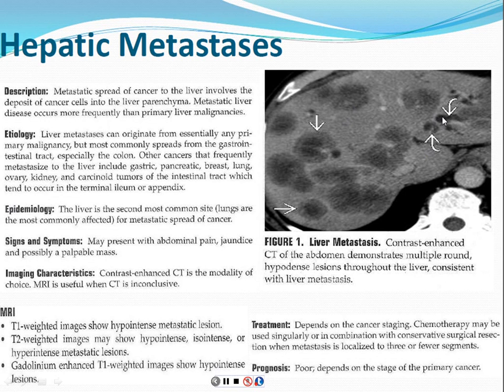These are some dilated bile ducts. They're linear branching structures that are not enhancing because the blood vessels are enhancing, of course. That suggests that some of these lesions may be blocking the bile duct drainage from the liver. So when you see multiple lesions in the liver like this, you start to think about liver metastases. And unfortunately, liver metastases are kind of common with certain cancers.